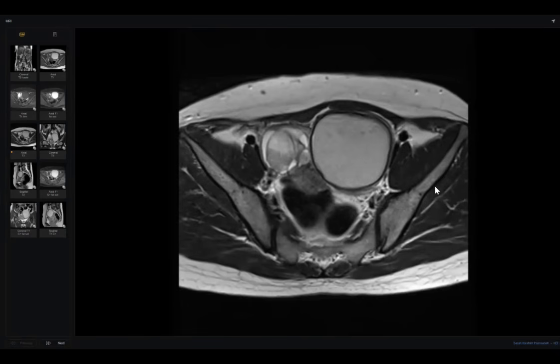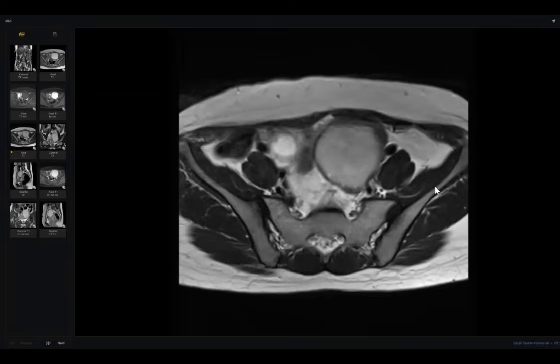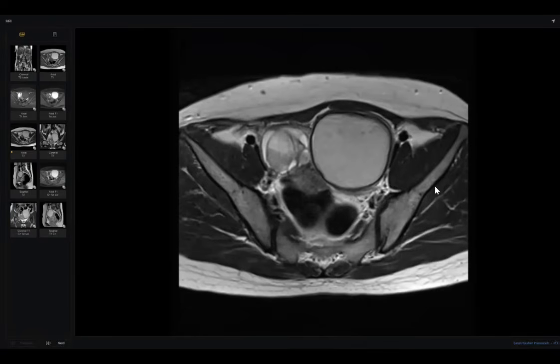T2 shading sign, sir. Okay. T2 shading. Yeah. So these are bilateral ovarian endometriomas. What else? Before I advise you, very golden advice. Do you remember it? To change the sequence, sir, can I?